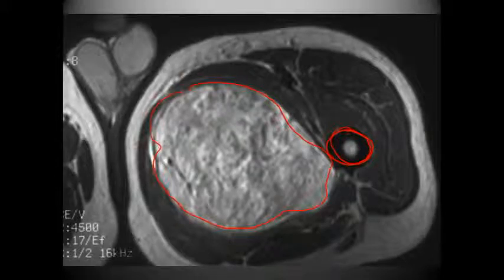And the reason we can say it's a lipoma is lipomas always are going to have the same appearance as fat. Lipomas, if you break it down, lipid, which is the first portion of lipoma, means that it's a fatty containing tumor. And so it should have the appearance of the subcutaneous fat that we see.